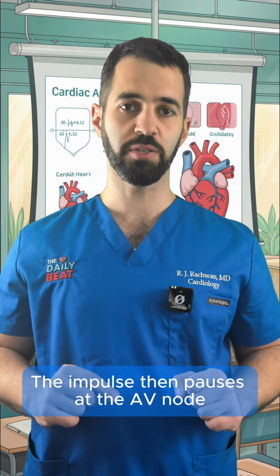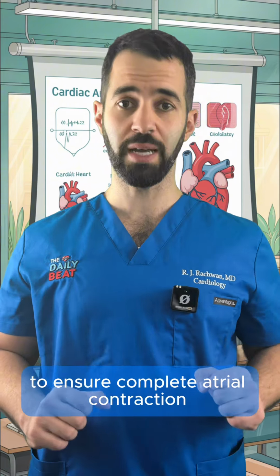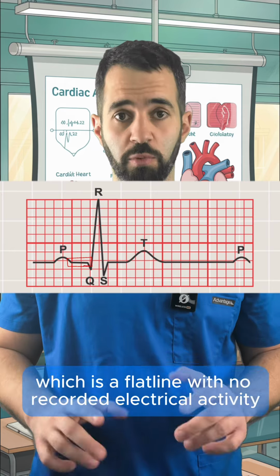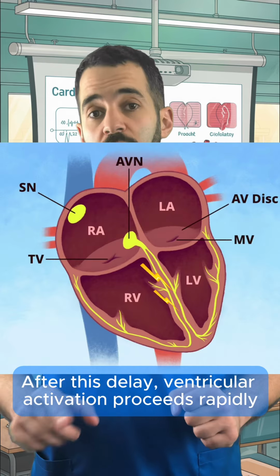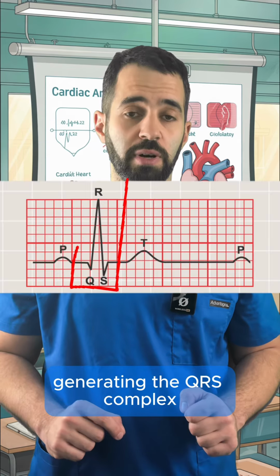The impulse then pauses at the AV node, which functions as a checkpoint to ensure complete atrial contraction and proper emptying of blood into the ventricle. This delay appears on the ECG as the PR segment, which is a flat line with no recorded electrical activity. After this delay, ventricular activation proceeds rapidly through the bundle branches and Purkinje fibers, generating the QRS complex.